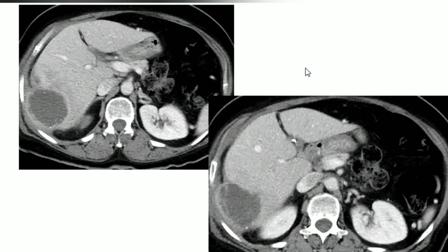So, ma'am, I'm thinking about the abscess again. This is most likely abscess. Yes. We don't see the gallbladder here. However, there are surgical clips at the gallbladder fossa, so most likely this is status post cholecystectomy. I agree with your description.